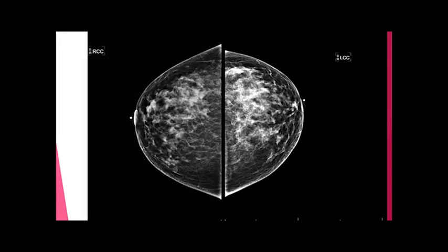So let's look at the images. Here's the right breast, left breast. We're going to see if the nipple is centered. We're going to go all the way across, and the nipple is pointing lateral, therefore we're missing lateral tissue. So I agree with the radiologist. There's a little air gap fold here, and they have good retroglandular fat over here, but here they don't have as much. So the radiologist called the patient back.